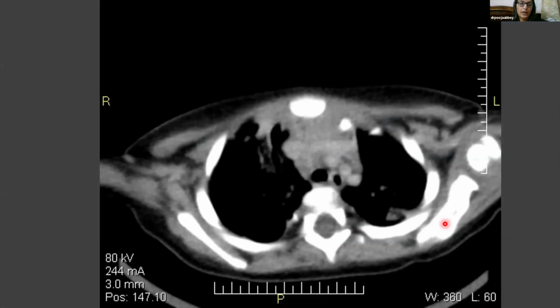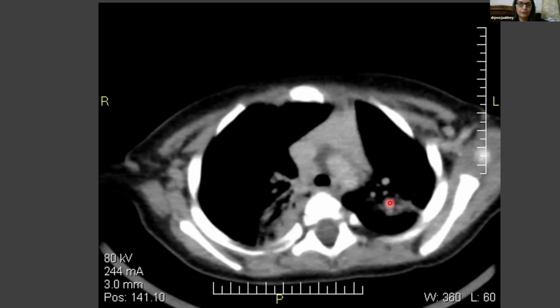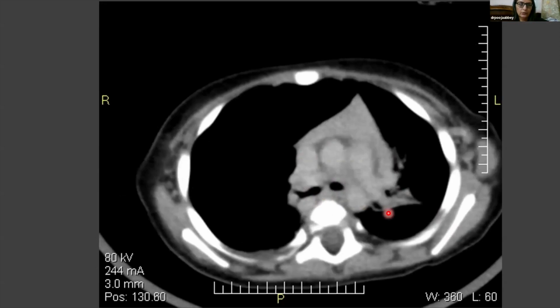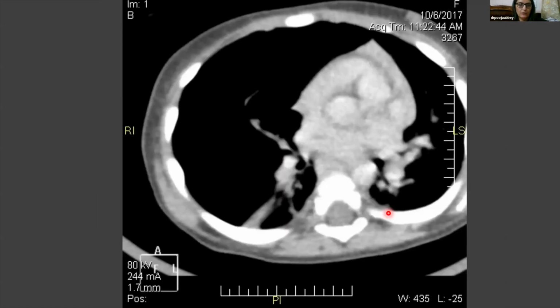So then looking at the mediastinal window, what do we see here? There was definitely evidence of lymphadenopathy, right? There was right paratracheal lymphadenopathy, which we saw, and slightly heterogeneous kind of enhancement of that lymphadenopathy, and here as well. Then precarinal lymph nodes are also seen, which are enlarged and causing extrinsic impression on the carina here. So that was about what we saw.